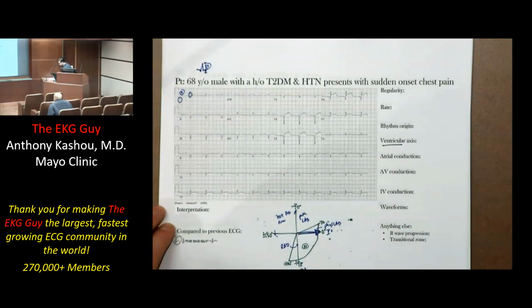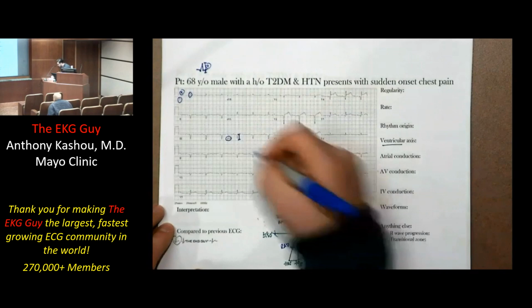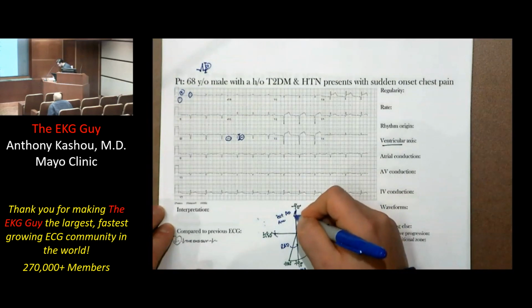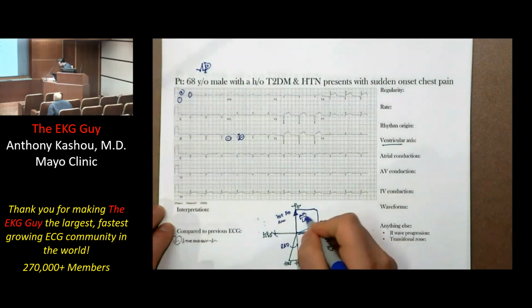Then I look at AVF, and AVF is right here, and when we compare it, we can see that this is mostly negative. We really don't have much of a positive deflection, so negative. Here's the positive end of AVF, so we go away from it in the negative direction to this direction. That leaves us in this region, so this over here, which we said is either physiologic or pathologic.